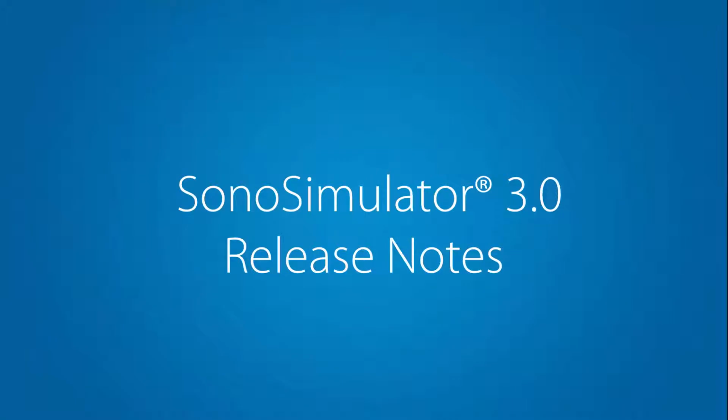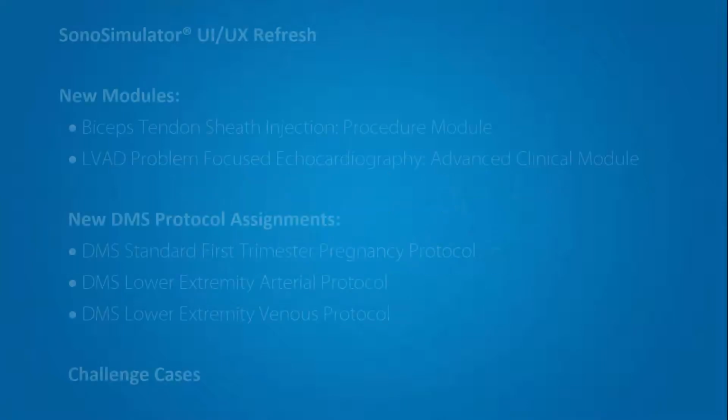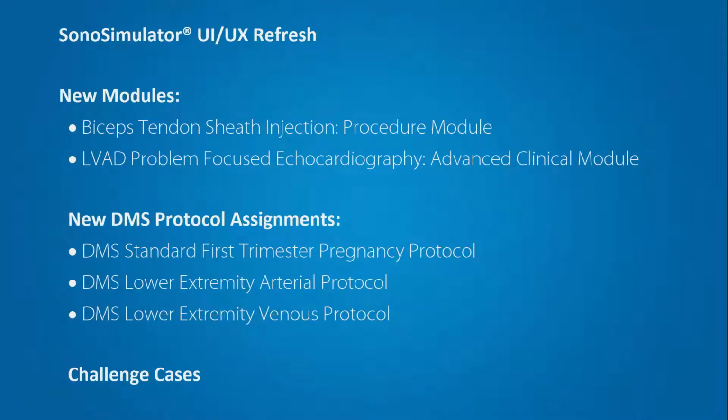Team, I'm so excited to present to you the 3.0 SonoSimulator release. This release is loaded with upgrades and new content. We'll start with an overview of our enhanced user interface.